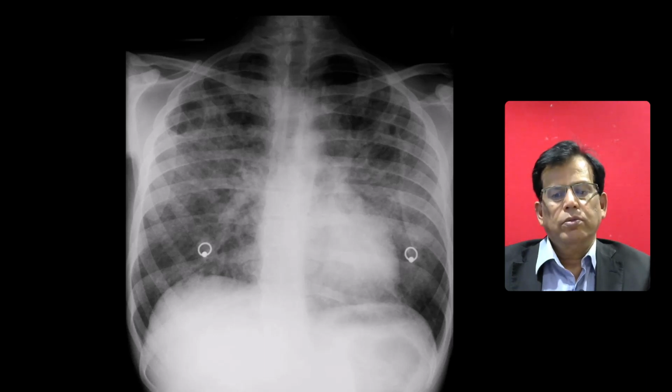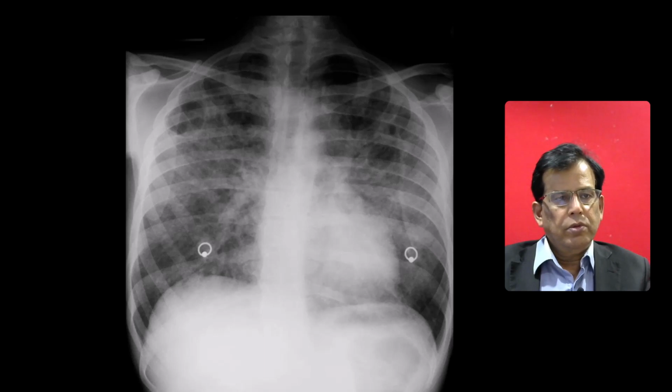In my routine practice, I would like to discuss this with my referring physician and go for cross-sectional imaging to get more insight into the patient. There are airspace perihilar opacities, or even on the CT scan, there are a few areas of emphysematous bullae, widespread upper zone, and the pleural CP angle was spared.